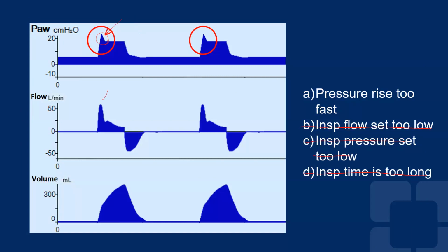So let's just look at the components of the breath. We talked about the resistive and elastic load, and when it's a square waveform, the resistance is continuous. It will be the same load throughout the breath. And obviously, if you do a pause, as you see here, the resistive load disappears. That leaves you with the elastic load, which you see manifested here as this blue triangle.